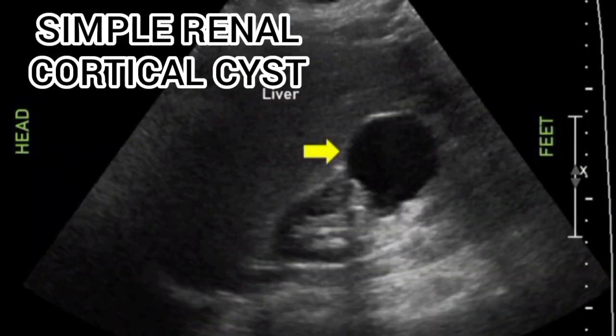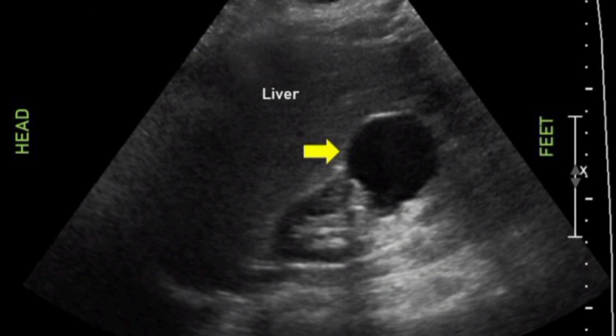But on ultrasound, they are typically rounded or spherical, anechoic, well-defined, thin-wall cystic masses with posterior acoustic enhancement, like you'll see in this image.